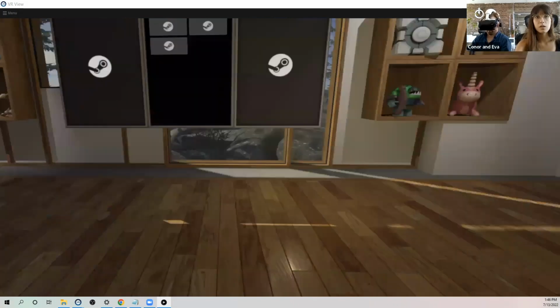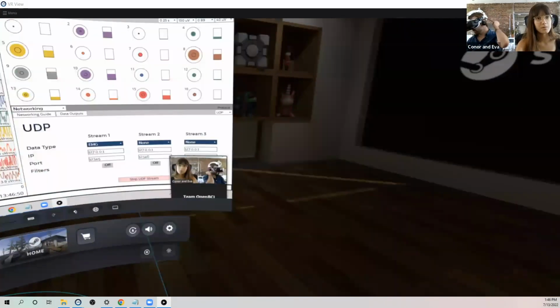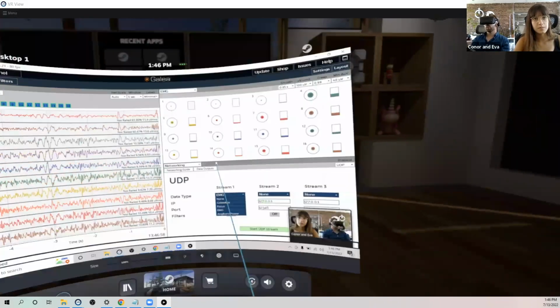Cool. Okay, so let's show them. I think we can show synesthesia room. Great. So we're going to show you another one of our demos. I'll stop the data. Yeah, if you can open the band power.